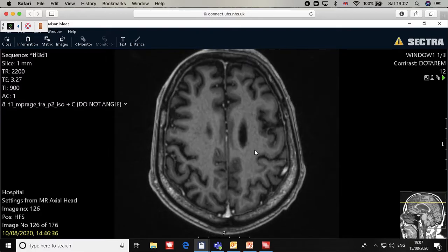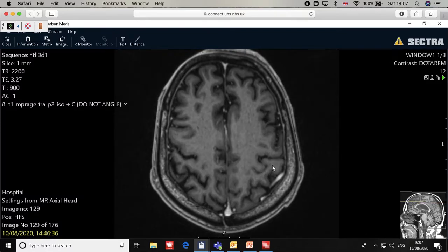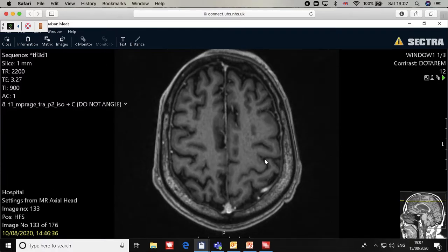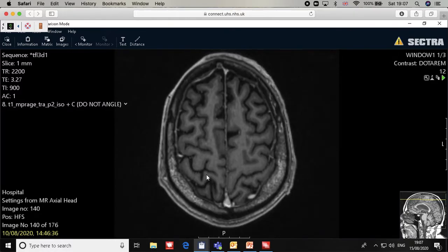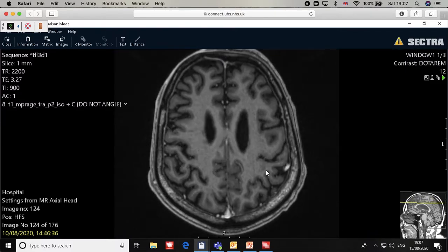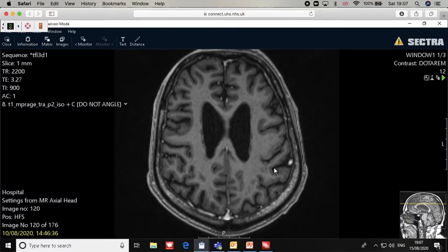So when you go to the MRI, again, this is a T1 MRI, and this is, by the way, the central sulcus. You can see the inverted omega shaped central sulcus, and this will be the precentral gyrus, where the motor area is located. Postcentral gyrus is a very important landmark in brain. And this is the largest sulcus that's very close to the midline, so you have to familiarize yourself with this if you are doing brain tumor. The central sulcus is very important. The omega sign of the central sulcus is the motor area for the brain, and nobody can touch this region, by the way, if any tumor is lying there.